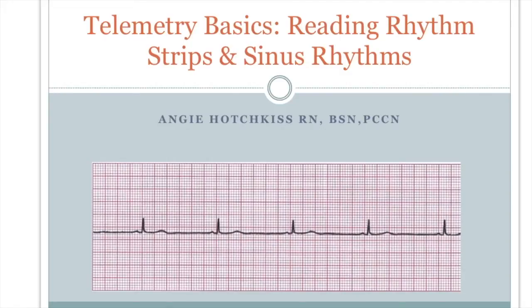In the second video for week 1, we're going to be discussing how to read a rhythm strip and then go into our first set of rhythms called sinus rhythms.